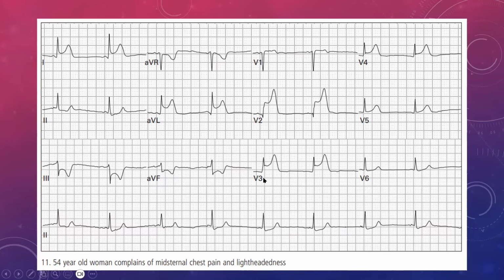Now, do you think this is a mild infarction or a severe infarction? Anybody, you can just guess. You've got a 50-50 chance of getting it right, or let's say a one-third chance. Is this a mild MI, a moderate MI, or a severe MI? What do you think? I'll give somebody a chance to put it up in the chat.